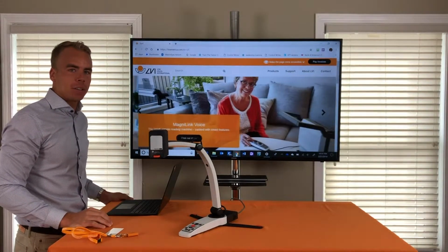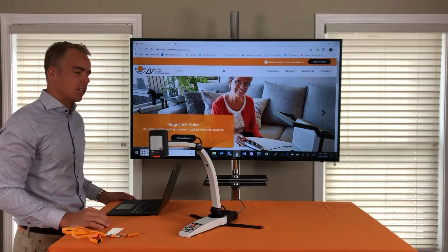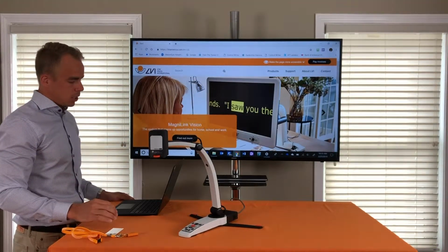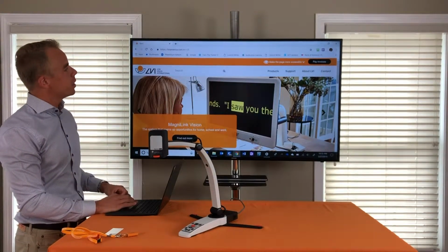I'm with LVI America, and in this video I'm going to show you how to install your software on a PC Windows-based computer for your Premium S2 MagniLink. You can do it in two ways. You either go to our website lviamerica.com, which I have up here in the background.